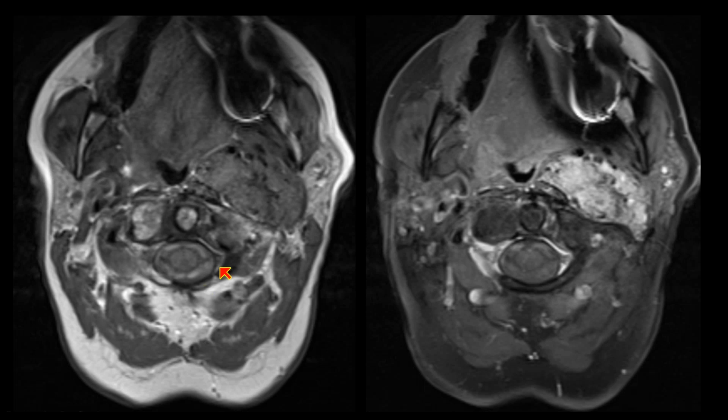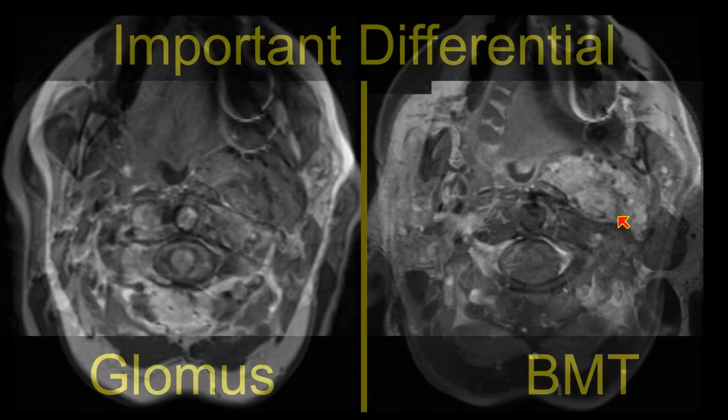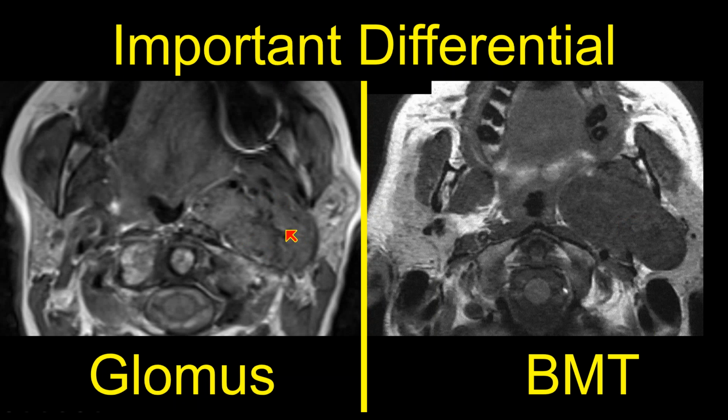And I was looking at this imaging study, and I said, well, this really doesn't look like a pleomorphic adenoma or benign mixed tumor. It looks like there's a bunch of flow voids in this lesion. It looks actually more like a salt and pepper lesion, like a paraganglioma. And we see how it's pushing the fat, so that tries to help us with our diagnosis. And it does cross the stylomandibular notch or stylomandibular tunnel, a space between the mandible and the styloid process. But the enhancement is also very different than we expect with a benign mixed tumor. And this was actually a glomus vagale, a paraganglioma lesion that was centered a couple of centimeters below the skull base.